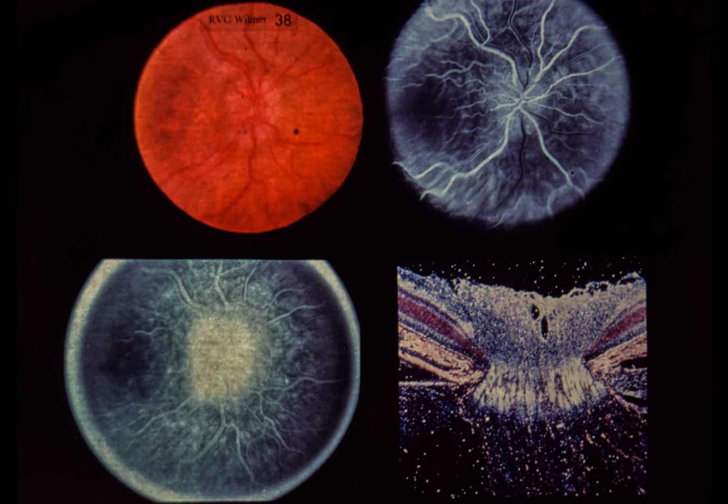Optic disc edema and hypotony. This 60-year-old male had an uncomplicated intracapsular cataract extraction in his right eye. Postoperatively, he developed a shallow anterior chamber with an intraocular pressure of 2 due to a cyclodialysis cleft. Upper left. The right optic disc is elevated and slightly hyperemic. It is seen through hazy media due to severe hypotony.